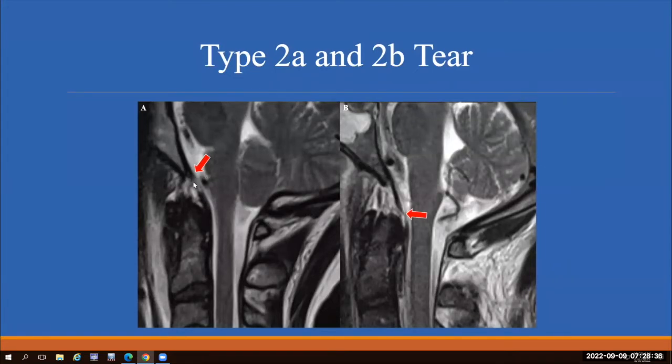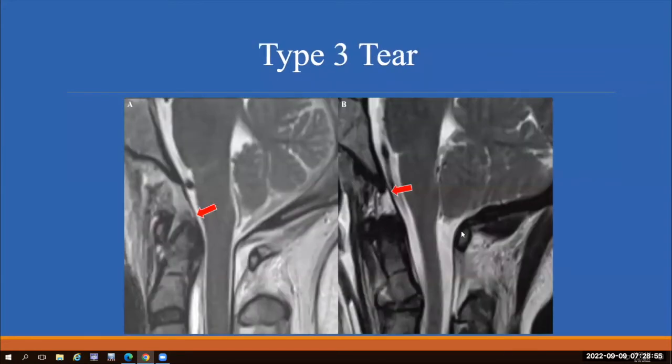And you can have tears that occur near the basion of the clivus. This is the basion, so a tear at this level, or you can have these tears down lower in the tectorial membrane. And again, that dark line is interrupted, there's increased T2 signal within the ligament. So that's also an example of a tectorial membrane tear. It can have these different looks because it's such a long ligament.